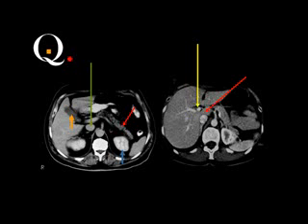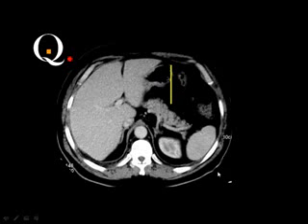No, the hepatic veins will be seen when the inferior vena cava is adherent to the liver, and the hepatic vein will enter the inferior vena cava. But this is the region of the porta hepatis, and you know this is the portal vein, and this is the inferior vena cava. The tissue between the portal vein and the inferior vena cava is the caudate lobe. Okay. Then this is the pancreas, and the vessel running posterior to the pancreas is the splenic vein. And this is the landmark that you are cutting in the inferior segments, okay?